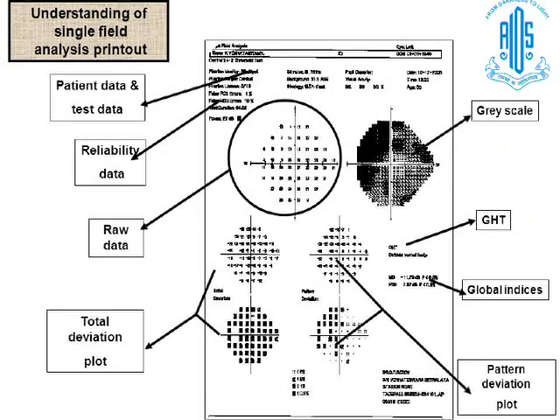Now I briefly talk about the understanding of the single field analysis printout. For better understanding, the single field analysis printout is divided into zones.